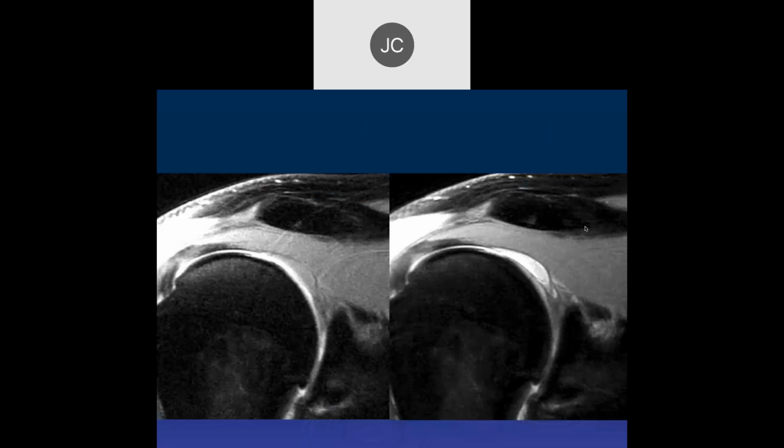Okay, so here, looking for the superior labrum, I think the superior labrum is displaced medially. I think that's that tissue medial to the glenoid there. It looks very medial to the glenoid. Over here, yes, that's fat in the suprascapular notch. Oh, okay, the fat suppression. So the labrum is just very degenerated here, but we have this funny fluid collection that looks like it's outside the capsule. If this were the capsule, you would expect it to go into the joint space.